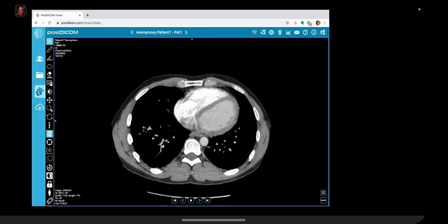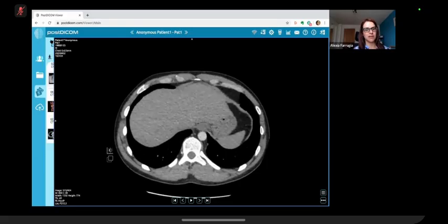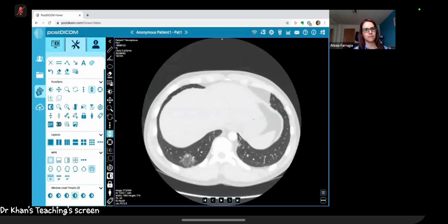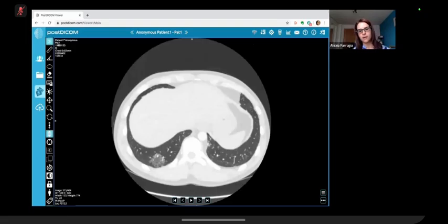So I'll show you the lung window. Okay, I'll scroll through once again.